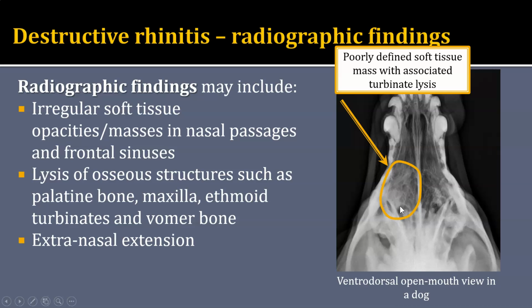So in this patient, there is this kind of poorly defined soft tissue mass in that region. And if we look, I'm starting to lose the larger bony structures that I can identify on the normal left side. So that means that there is lysis, because remember back here, fluid should not be able to silhouette with our big bones. So there's definitely lysis as soon as I can't see them.